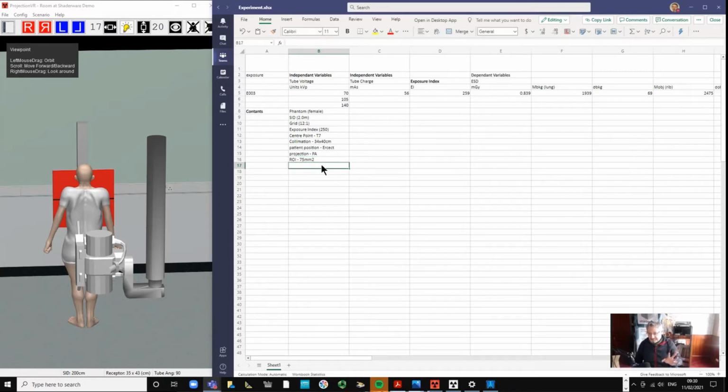And we have put the measurement area: obj is the right 7th posterior rib in mid-clavicular line. So that's the object.